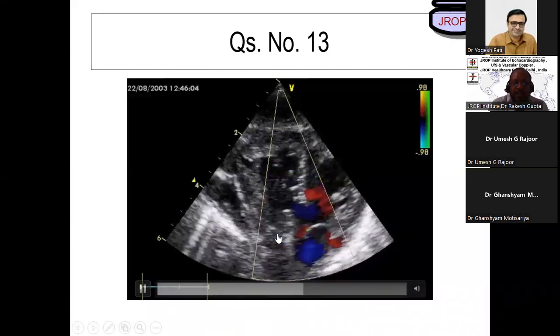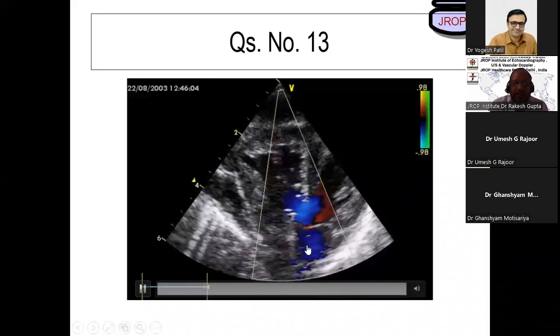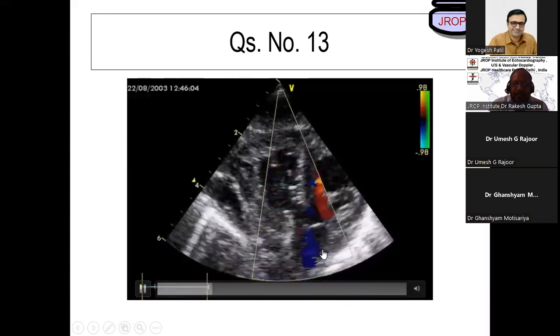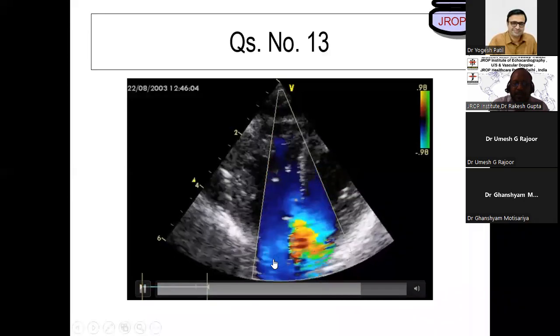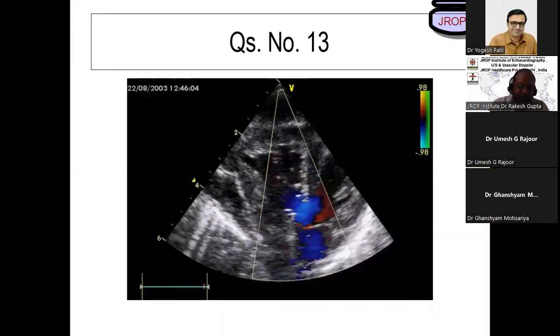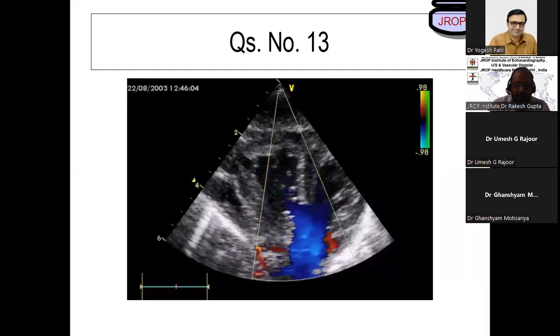Look, one vessel is arising from here, the second vessel is arising from here, and they are in reverse direction. So this is LV, this is RV. So this vessel is aorta, this vessel is pulmonic artery. And the answer we get is by looking at their bifurcations. So good attempt, Yogesh. And I'll come back to you. You're really good. I must appreciate you, Yogesh, for your attempts.